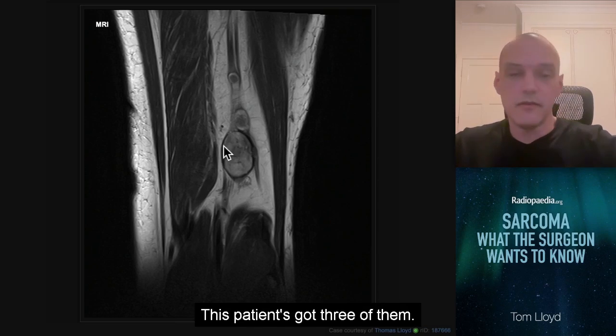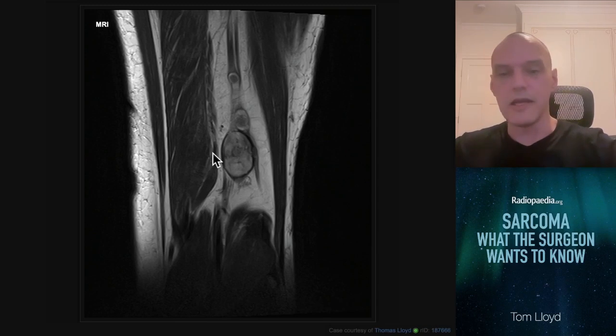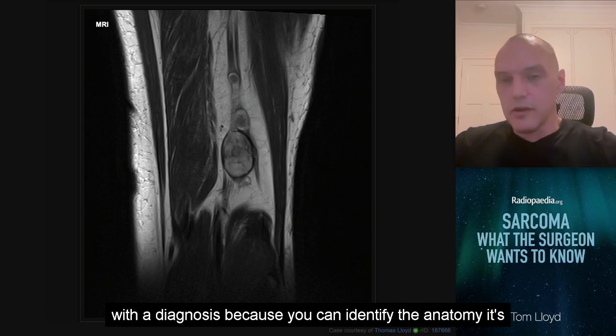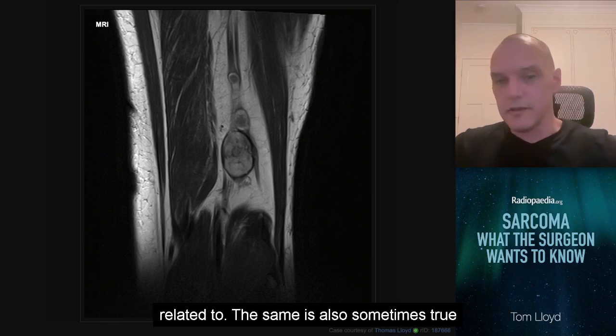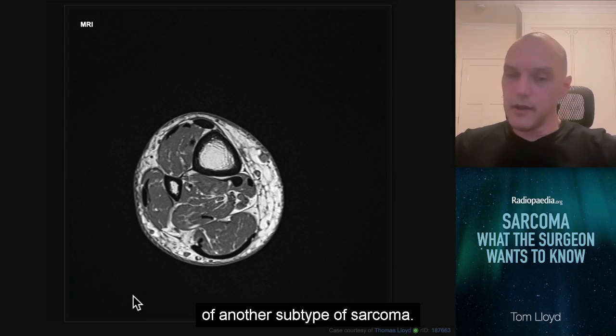This patient's got 3 of them, so they might have some sort of syndrome like schwannomatosis, which is sometimes called NF3. But this is a case where you can be quite confident with a diagnosis because you can identify the anatomy it's related to. The same is also sometimes true of another subtype of sarcoma.